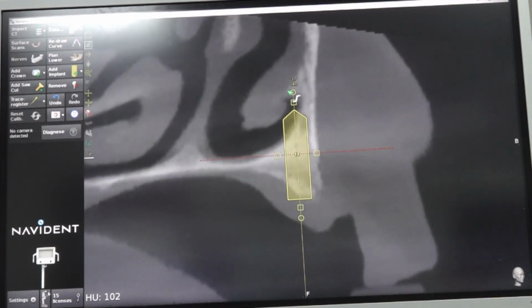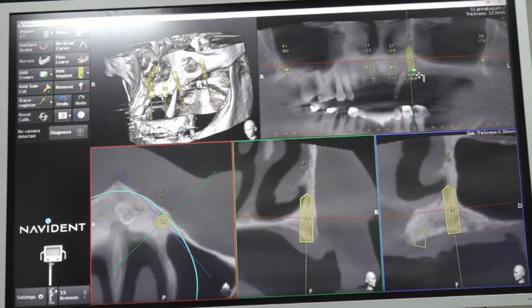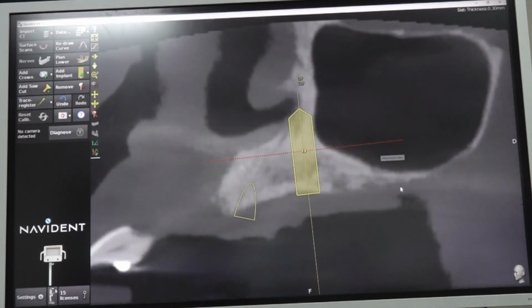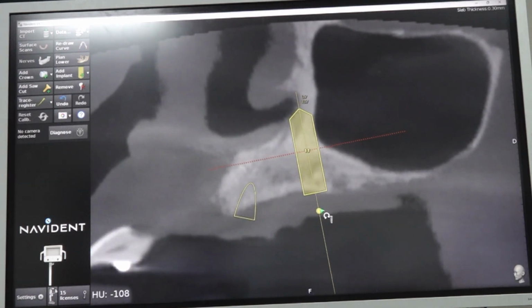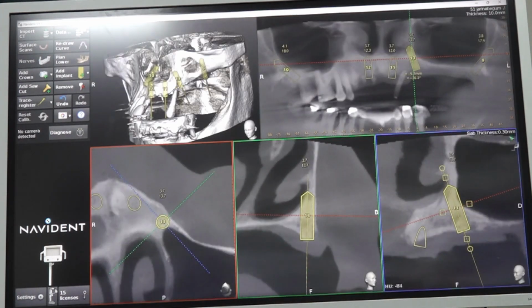After that also, palatal approach. 13 mm, right? Here we are not going by any augmentation. So 13 mm, 3.75 mm, very minimal diameter, very less bone. Okay. What we can do is we can just slightly tilt this here, slightly here. We'll see what it is. So that we can reduce the inter-implant distance. Okay.